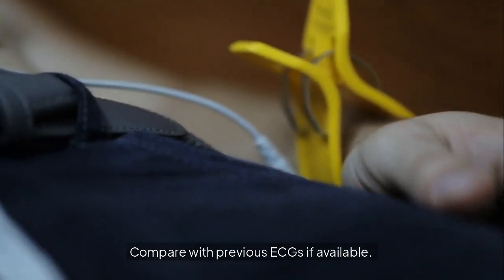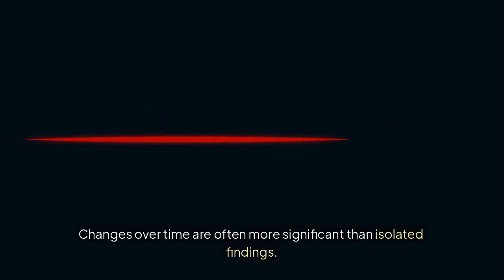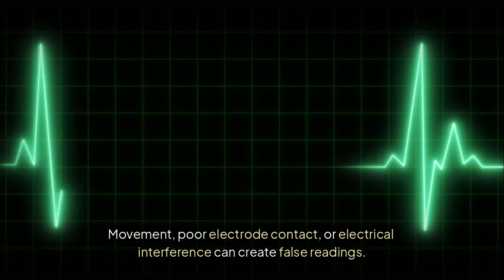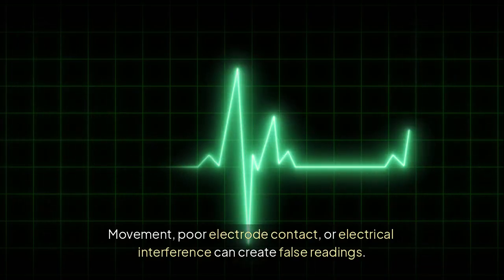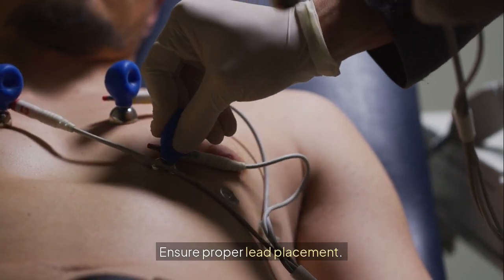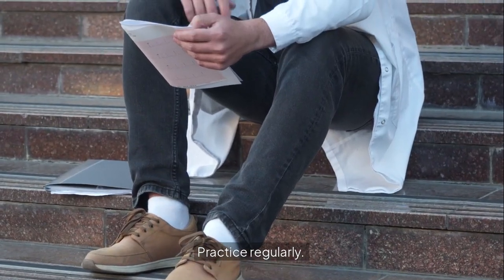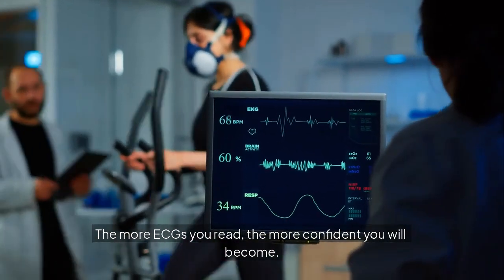Compare with previous ECGs if available. Changes over time are often more significant than isolated findings. Be aware of artifacts. Movement, poor electrode contact, or electrical interference can create false readings. Ensure proper lead placement. Incorrect placement can mimic pathological patterns. Practice regularly. The more ECGs you read, the more confident you will become.